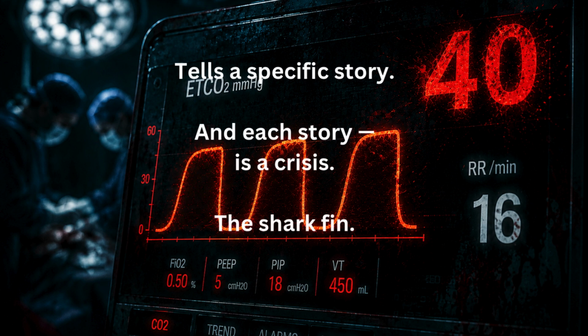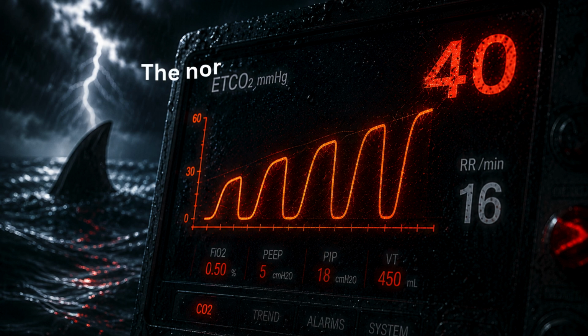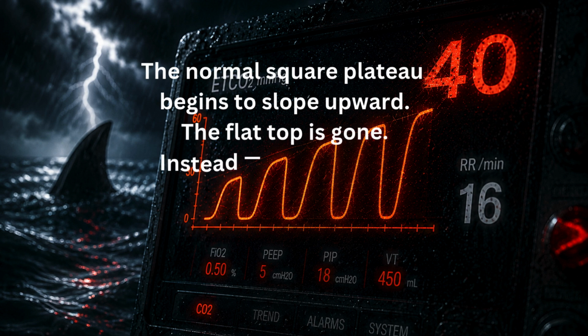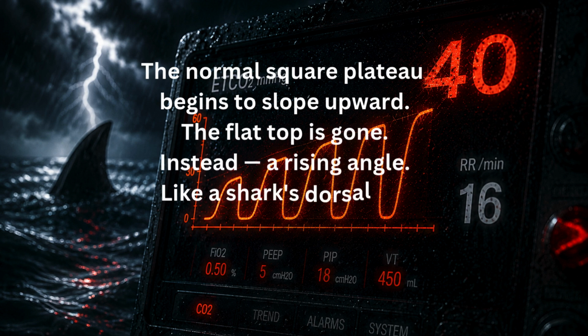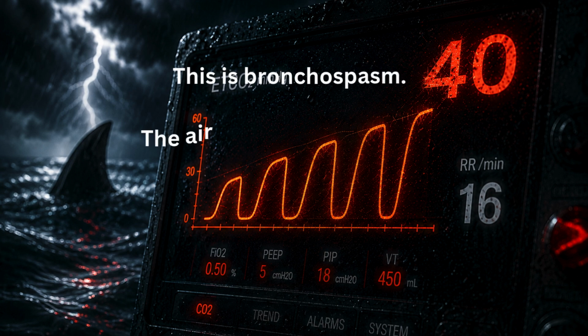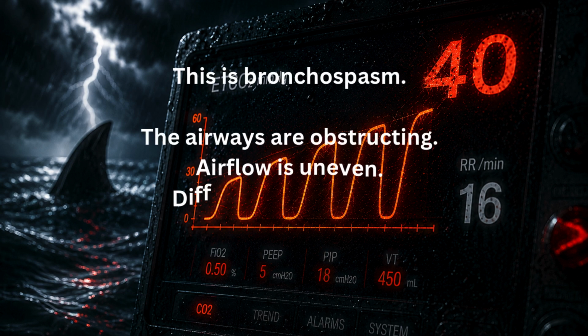The shark fin. The normal square plateau begins to slope upward. The flat top is gone. Instead, a rising angle, like a shark's dorsal fin cutting through water. This is bronchospasm. The airways are obstructing.